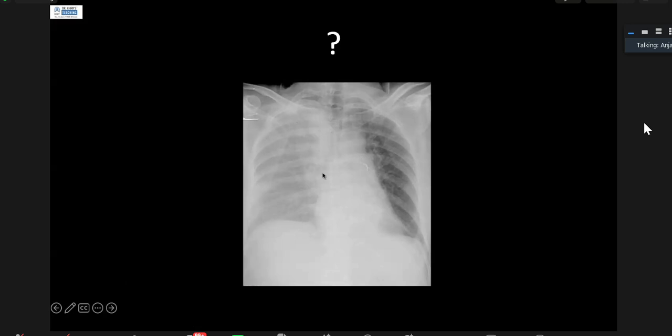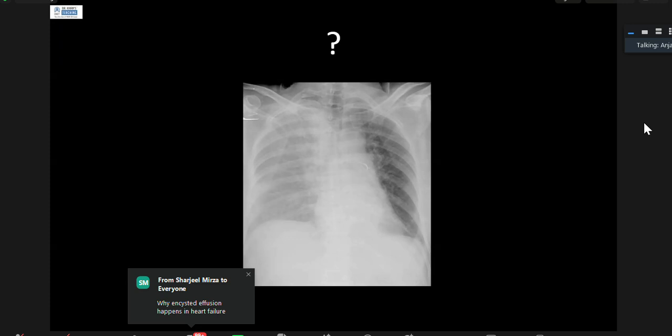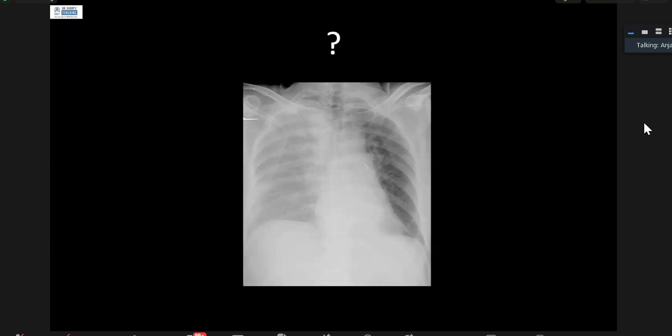What happens is, when there is a moderate effusion and the patient lies down, fluid will gravitate down to the posterior pleural layers. So when the X-rays pass through the anterior aspect, they go through the air-containing lung and then through the fluid in the posterior aspect before they fall on the X-ray receptor. That's why we're not getting a dense white kind of effusion here, because the X-rays have passed through air-containing lung before going through the fluid.